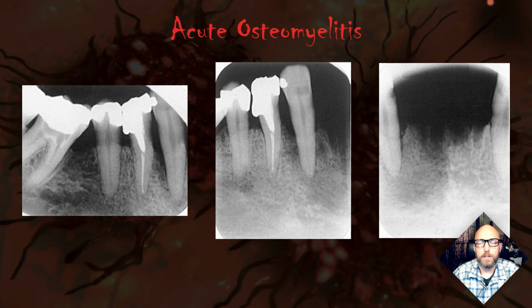And in fact, I always tell the story of one case that I got. It was a cone beam case, but it looked like a malignancy where it was just really destroying the bone, had an ill-defined blended border, starting to seep around the teeth. And on the differential, I had malignancy first because we wanted to be wary of that. Of course, they did biopsy and it came back just inflammatory cells. This was a surgeon treating it.